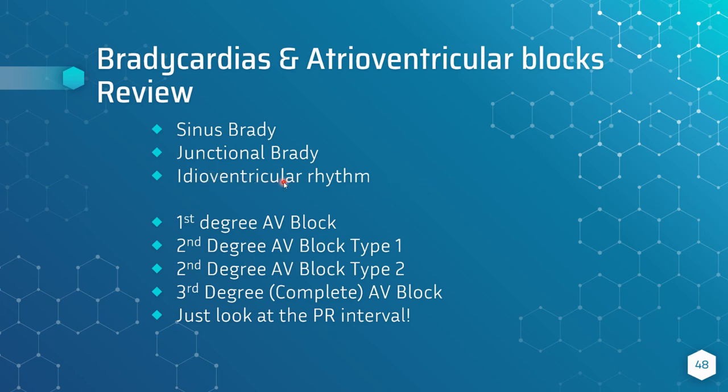Now, one thing with idioventricular, you'll see accelerated idioventricular in patients with coronary artery occlusion. So if you have a patient who has a coronary artery blocked and you give them a thrombolytic, so things such as alteplase, the patient usually goes into an idioventricular rhythm, specifically accelerated idioventricular rhythm, and that's normal.